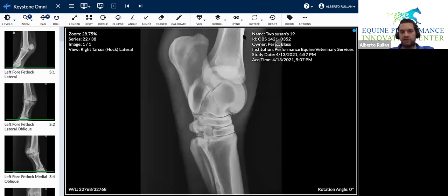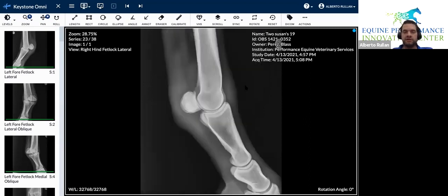Now the hock, let's practice. Distal, go ahead all the way to the tibia, intermediate ridge of the tibia, caudal tibia, done. Calcaneus, all the way around the calcaneus, done. Sustentaculum tali, done. Talocalcaneal joint, done. Proximal intertarsal joint, distal intertarsal joint, tarsometatarsal joint, MT3, the two trochlear ridges, done. That's a little bit more of how you do it in real time.